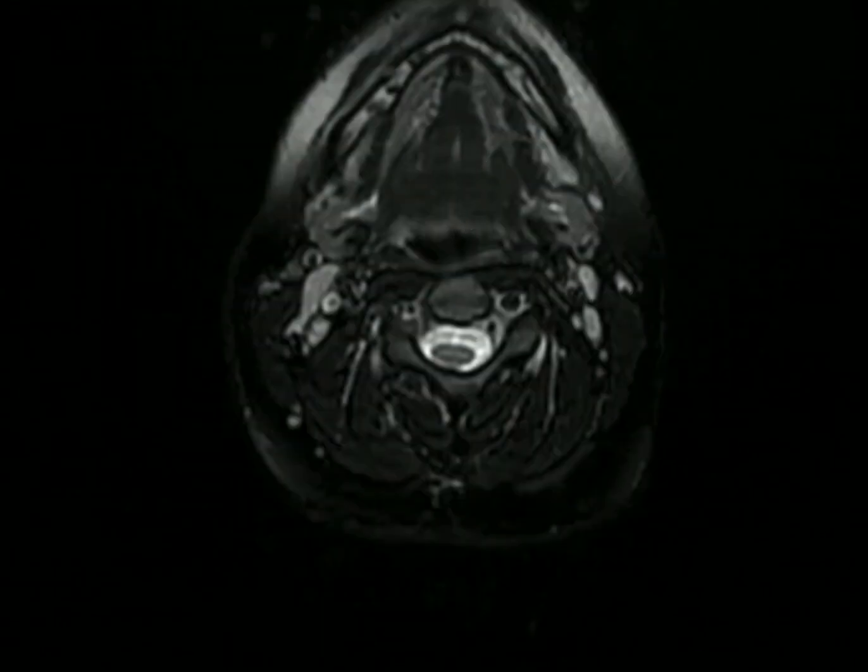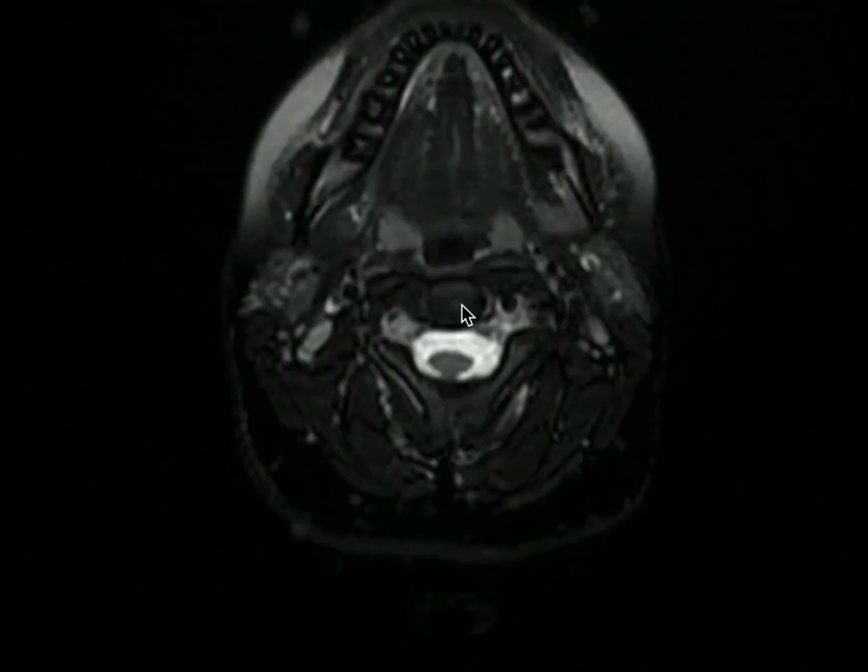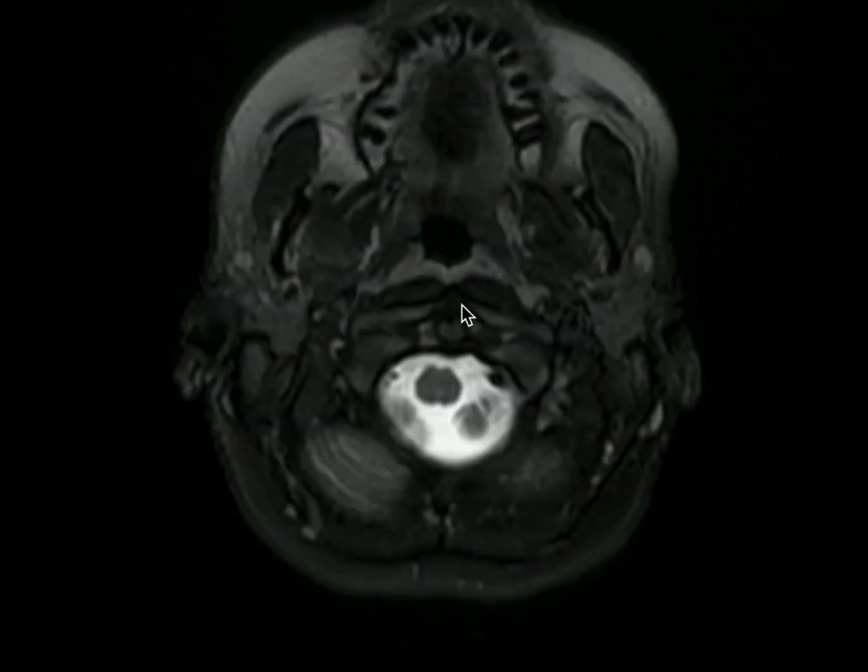MRI of the cervical spine is often obtained to look at the spinal cord or to evaluate ligamentous anatomy, as injuries to these structures may be occult on CT. However, as we have seen, many of the anterior soft tissues of the neck may also be visible and should similarly be evaluated, even if the study was primarily designed to look at the cervical spine. Let's now scroll superiorly up to the level of the cervicomedullary junction.